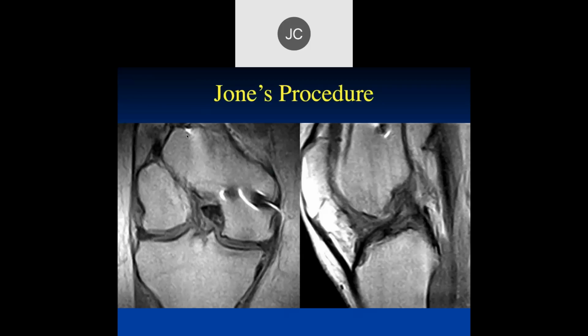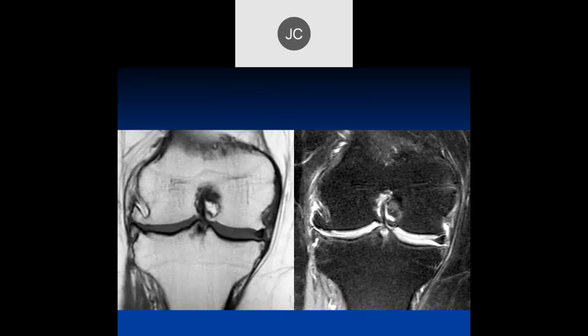This was in the pre-graft days. I don't think you'll see any of these now. Again, this is obviously not an anatomic position, so these aren't going to be perfectly stable. But if you see this and get confused by it, this is an old Jones procedure. It was done back in the 1960s and 70s.